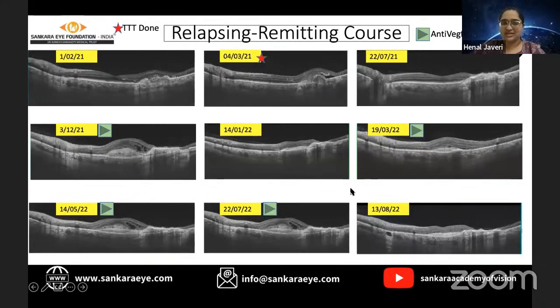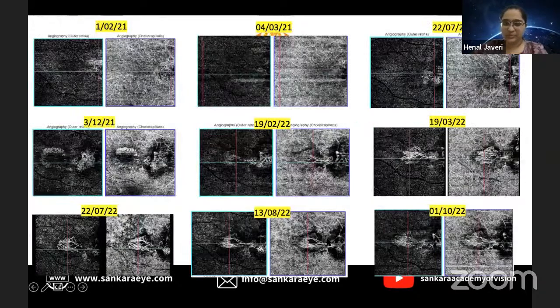So to summarize the relapsing and remitting course, the patient underwent TTT. This was the OCT picture at that point. And post that, the patient has received 4 injections whenever we have noticed activity. We can see the progression of the network on OCTA as well up till the last visit, showing somewhat of a pruned tree appearance of the old area, the extrafoveal CNVM area. And we can see the network in the subfoveal area.